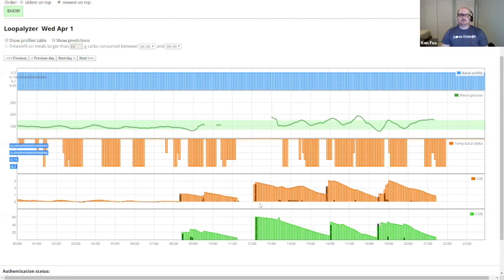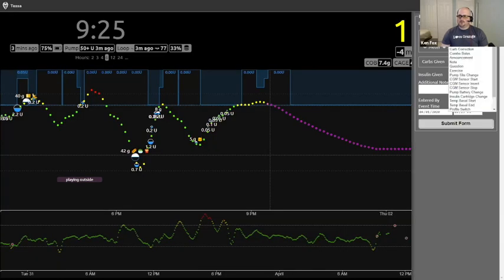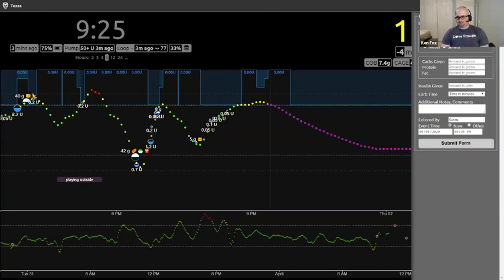So what I used to love about Nightscout is when we would log the food before Loop, and we do it on our Xtrip app or here in Nightscout, we would make notes about what food we had. I might even go back later if the meal went really well and I like hashtag win or something like that, or hashtag nailed it or something I'd remember, and I could search Nightscout for the last time I found the word pancakes and hashtag win, and or black bean muffins or something we made that's more unique, and I could find where that happens.